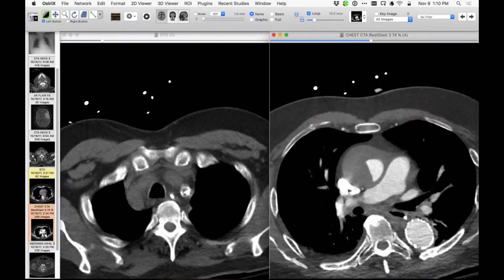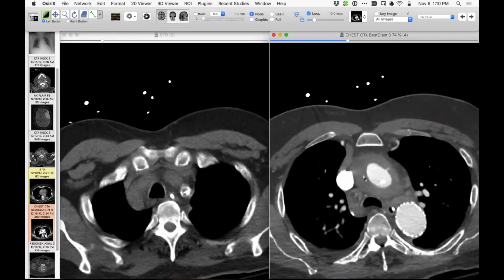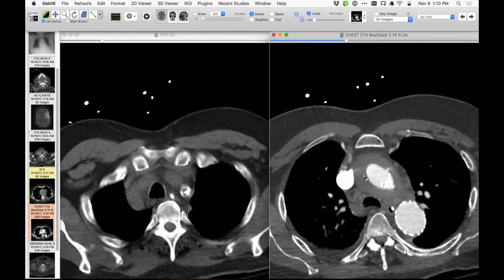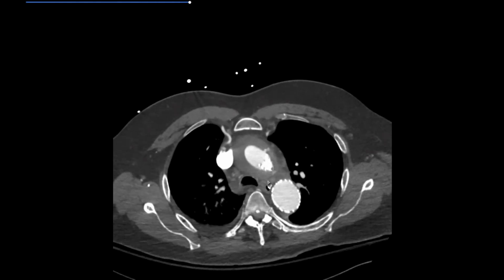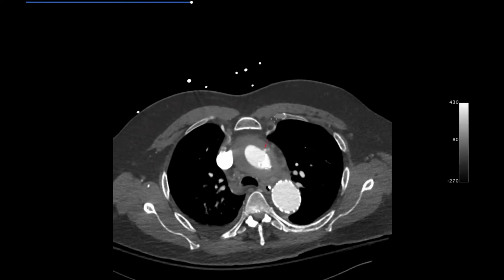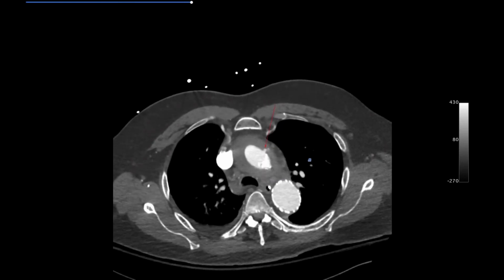Just one interesting thing I want to show you is something that we see not infrequently now, perhaps because we pay more attention to this. But here's a location in the aorta just before the stent, where one can see a little intimal breach right here, where there is a communication between the lumen of the aorta and the intramural hematoma just there. So a really interesting case of intramural hematoma, very extensive. And I'm not quite sure exactly what's causing the stroke, but he definitely has that too, of course.